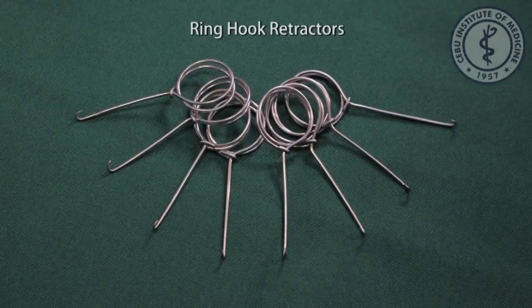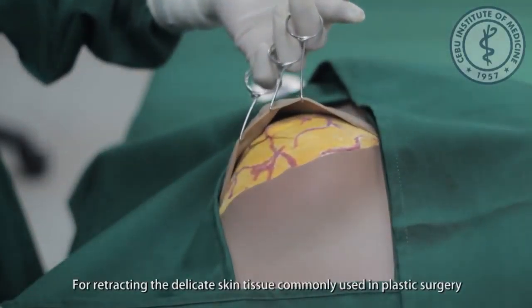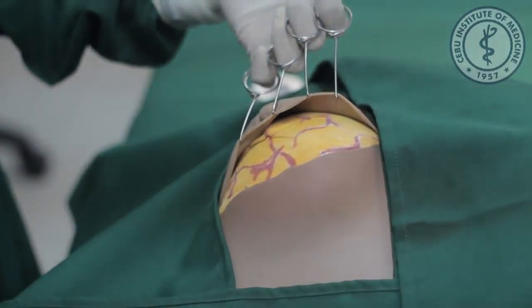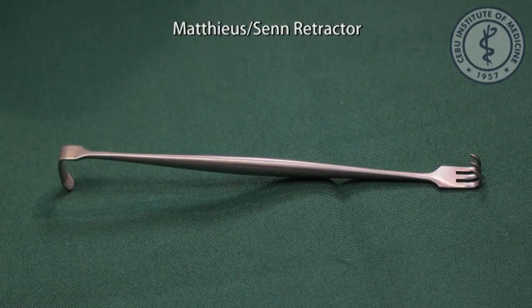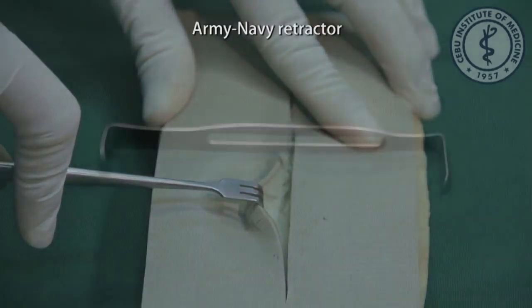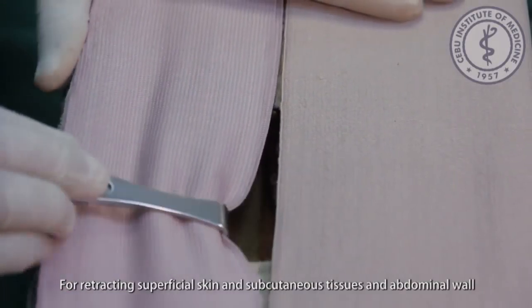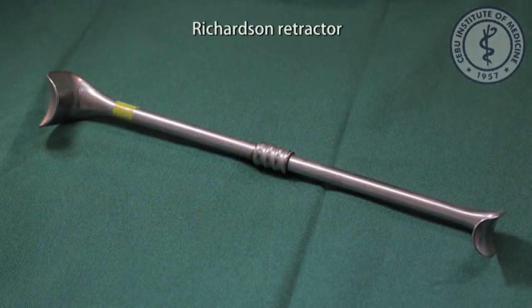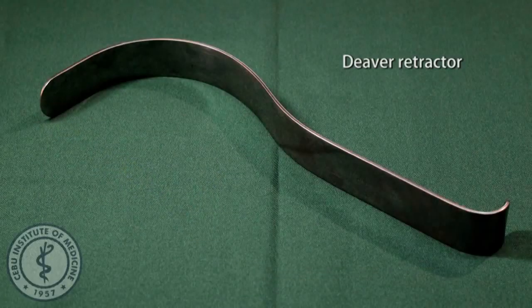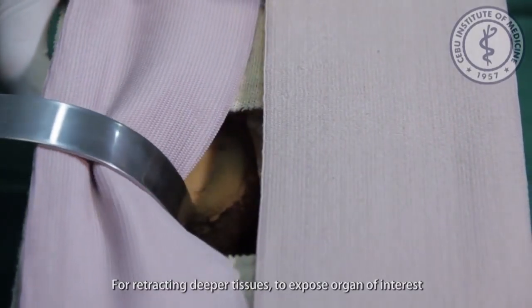Retractors. Ring hook retractors, for retracting the delicate skin tissue commonly used in plastic surgery. Senn retractor, for retracting superficial skin. Army-Navy retractor, for retracting superficial skin and subcutaneous tissues and abdominal wall. Richardson retractor, for retracting muscle tissue. Deaver retractor, for retracting deeper tissues to expose organ of interest.